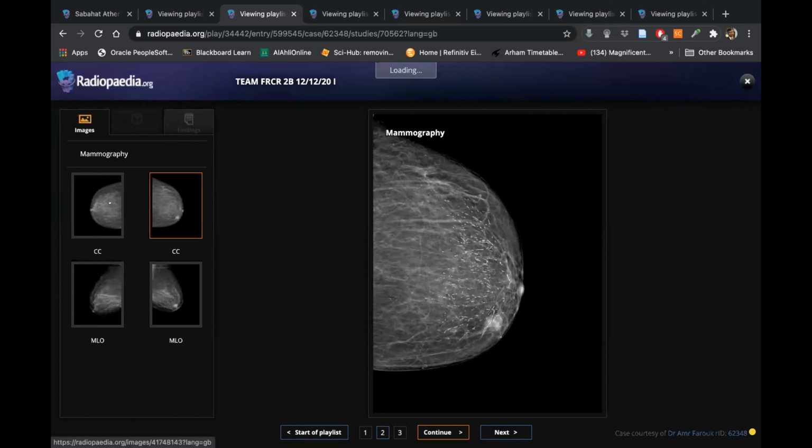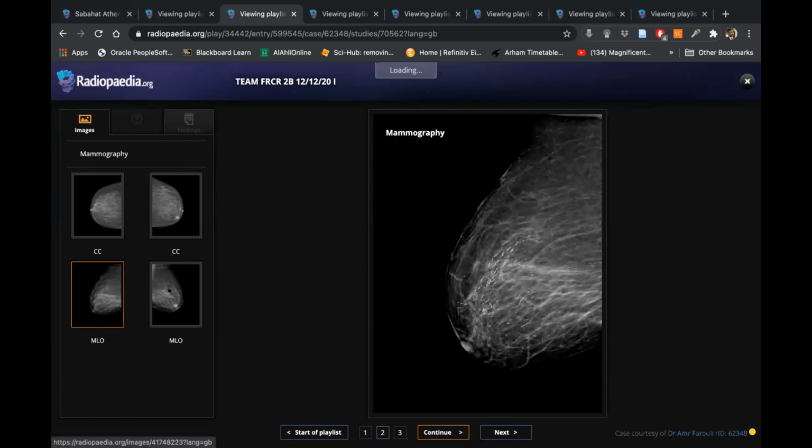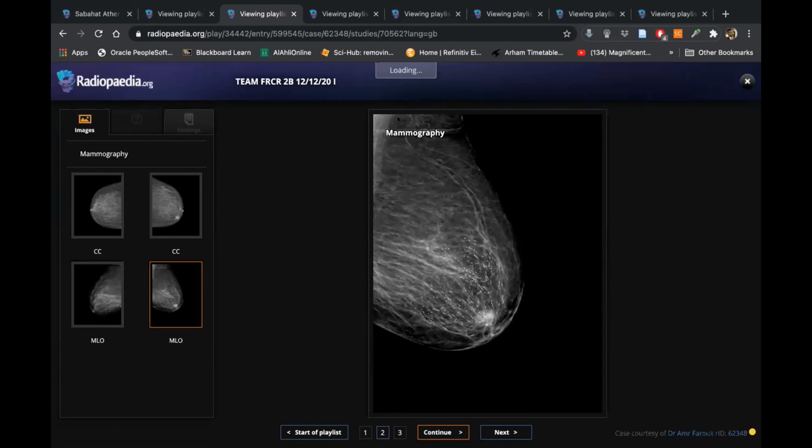Then you rightly said that you would look at the axilla to look for the lymph nodes. And one thing which I remember from Dr. Maheen, that it's not our job to diagnose malignant lymph nodes. Yeah. It's our job to point out that this lymph node looks suspicious, or this cortical thickening, or this is rounded, and FNAC should be done, right? Yeah. Yes. So otherwise, these were some points regarding the multifocality and multicentricity.